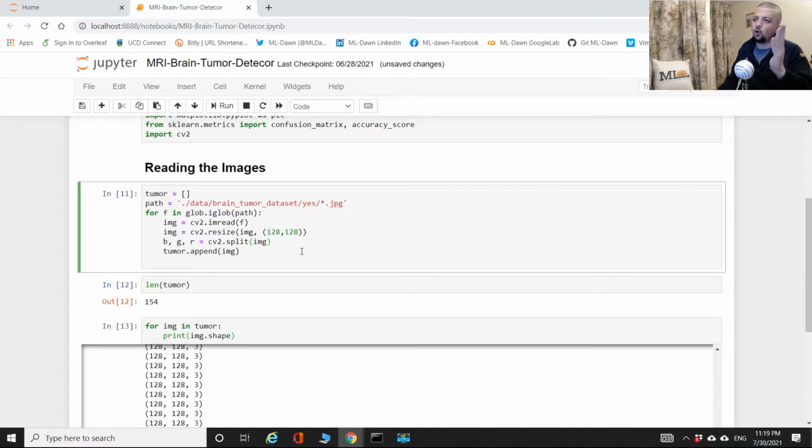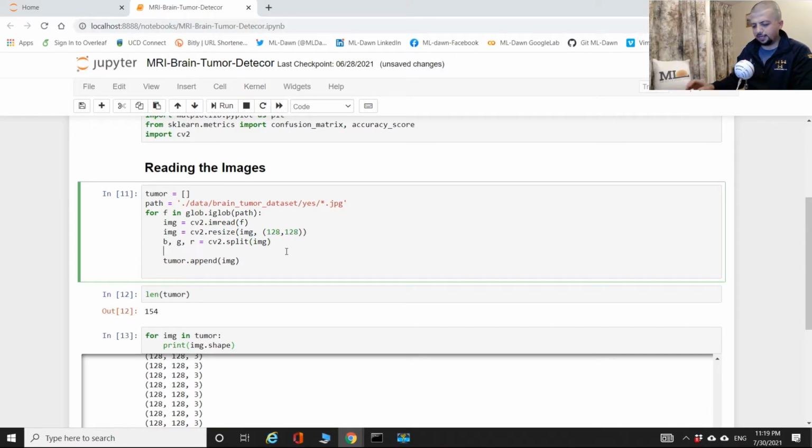I'm going to put them back into RGB order, merge them together, and put the result back into image, right? So what I'm doing is grabbing this image, splitting the channels, reordering the channels, and putting them back into the original image, right? Now we have a multi-channel image with the same order that we want, which is RGB. Now again, we're going to use CV2. The function is called merge, and under merge you pass these channels in the form of a list, right? So we'll have R, G, and B, and you put it back into your image.